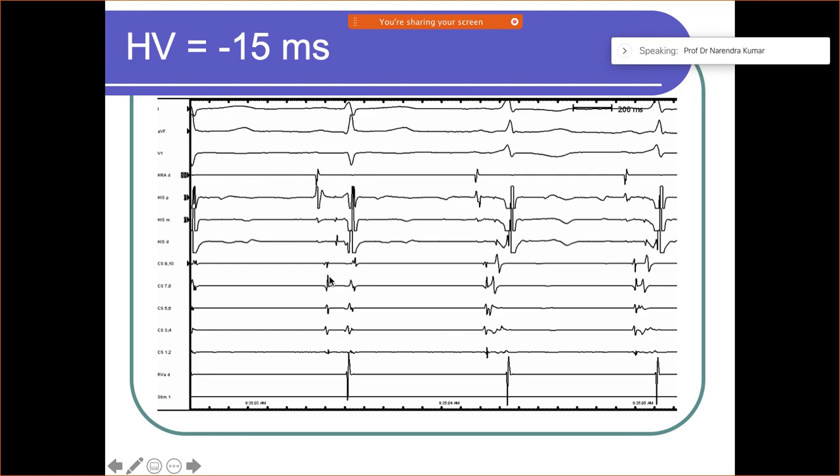Then come the coronary sinus catheters, you have put them up, the RV and the stimulating. Okay. Then what do you notice over here? In the first beat and the second beat, there's some difference, right? I think all of you will agree over here. In the second beat and the third beat, there's more pre-excitation. Okay, so the pre-excitation is there.